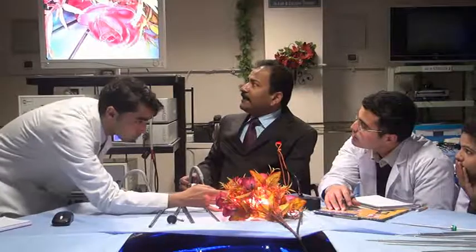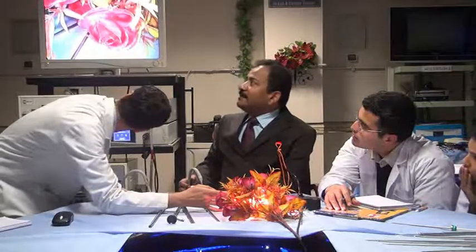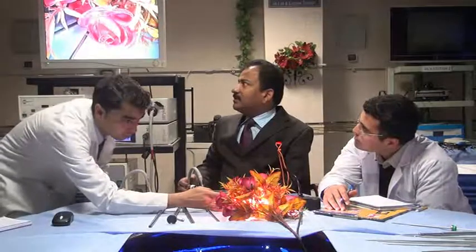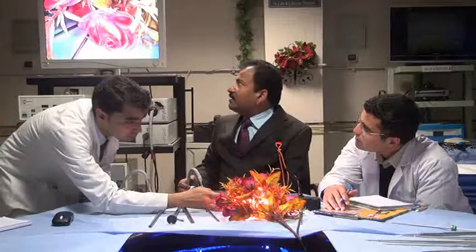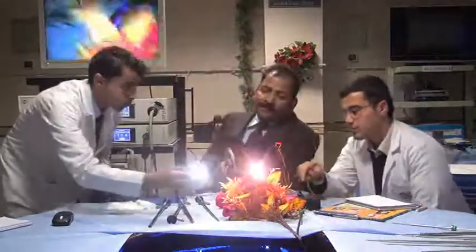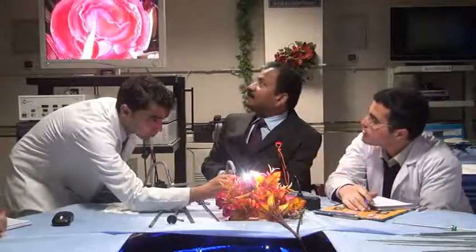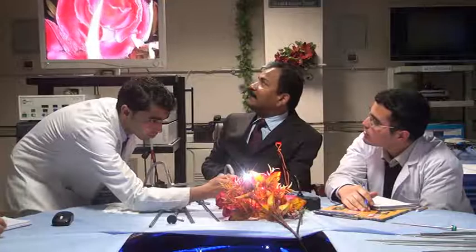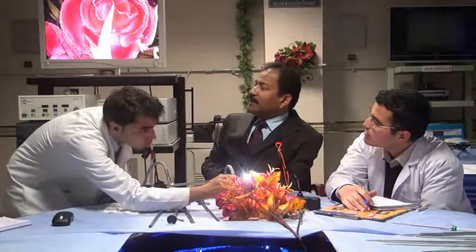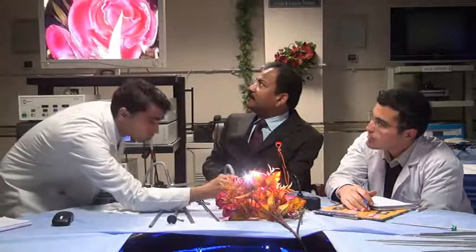So this way, once red color comes, it affects the intensity of the other colors, and then they will be lost. Even here the red color is not good. Yes, red color is not good. Can you put this? Same side, same place, I will put. The 3-chip makes it favorable for the red color. Yes. Green color.